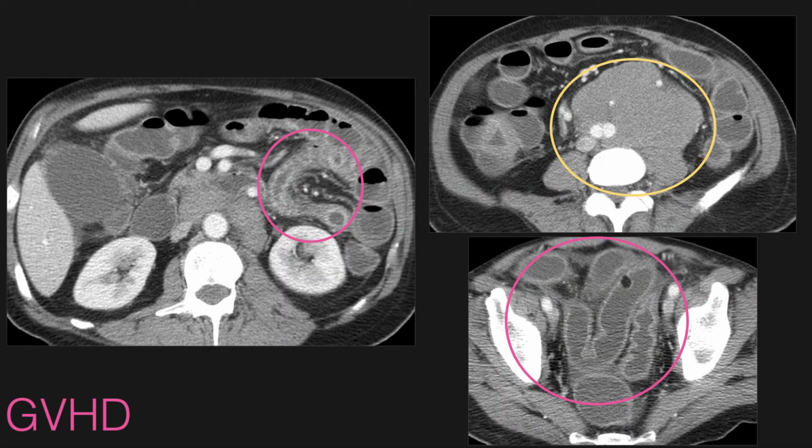This second patient presented with several dilated and thickened loops of small bowel and had a history of lymphoma and bone marrow transplantation with biopsy-proven graft versus host disease, another important cause of abnormal bowel thickening and enhancement in patients with bone marrow transplant history.